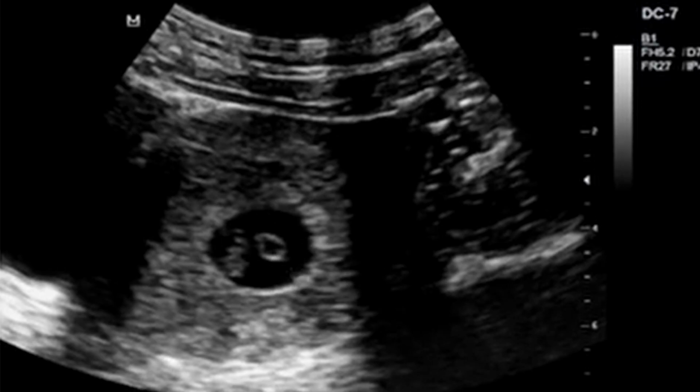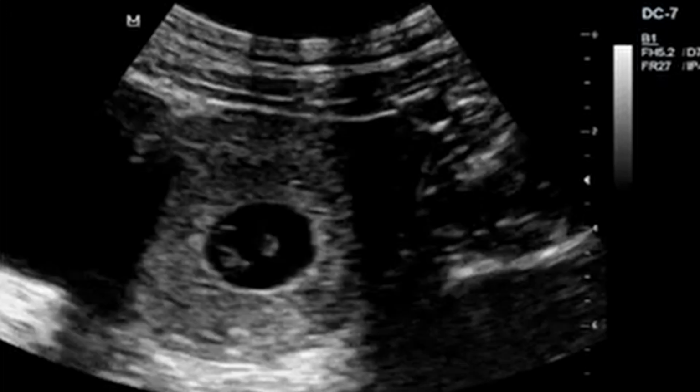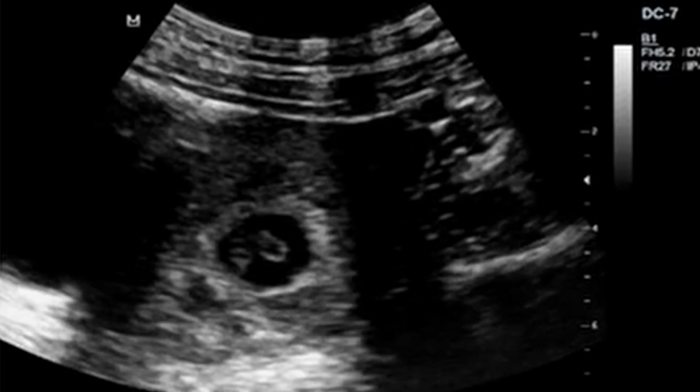So what is the yolk sac? The yolk sac essentially is a membranous sac attached to an embryo. It is formed by cells of the hypoblast adjacent to the embryonic disc. This is alternatively called the umbilical vesicle by the Terminologia Embryologica, though yolk sac is more widely used in most contexts. So in this presentation, I am also going to use the term yolk sac.